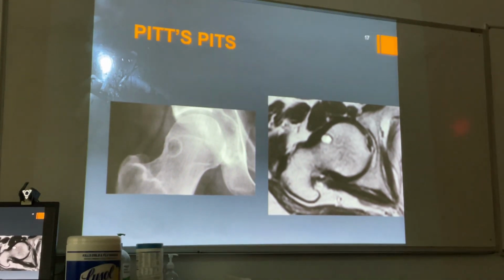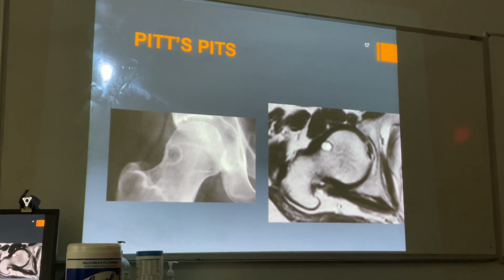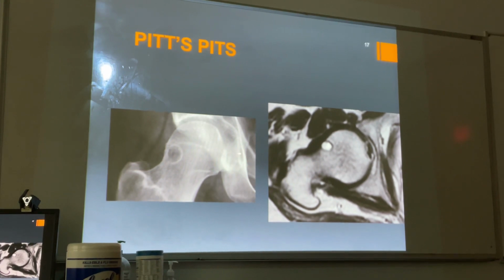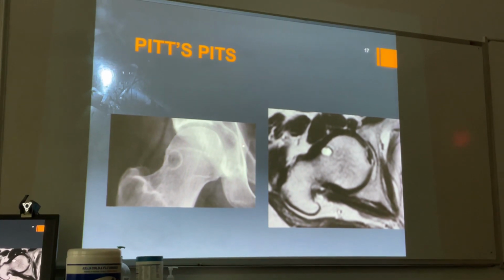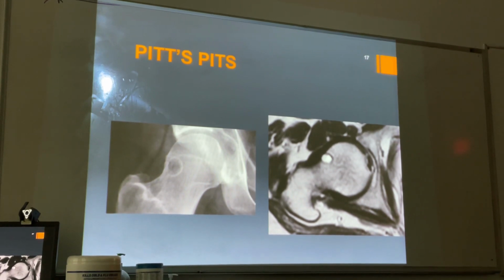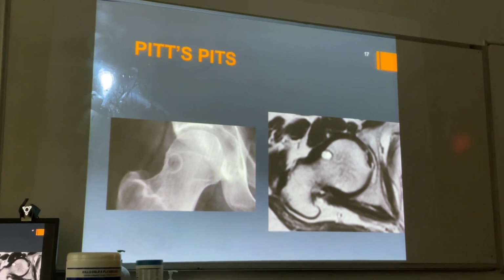And I think I was on the previous image. Nice pelvic teardrop. So the laser pointer goes down, comes back up. That's the teardrop, and then this is the ilioischial line. This is the iliopubic line. So the weakest point is a certain portion in this ilioischial line that is paper thin. It's like your scapula. That's why when you get a blow to the back of the traps, you can fracture not the spine of the scapula, but the weaker, more porous scapular body, depending on how you get hit.